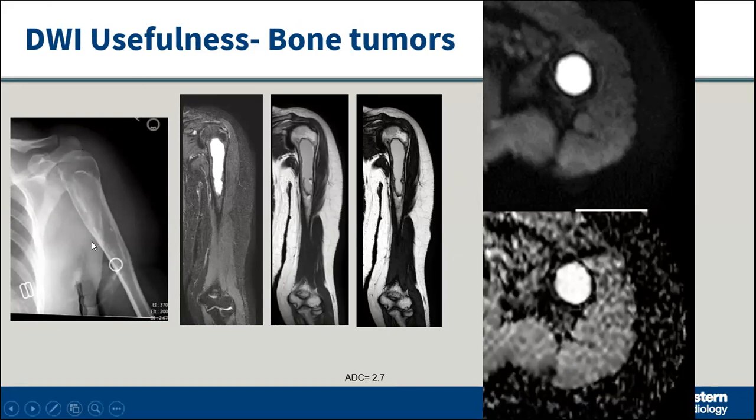So I'm starting with a very simple lesion, a well-defined zone of sclerosis, an elongated lesion along the bone. As the bone grows, it grows back into the diaphysis; it starts in the metaphysis. So you can see this cystic area there on T2 Dixon: water image, in phase, opposed phase. This opposed phase, or out of phase, is very good to find the margins of the lesion, or if there are any fractures, or any internal stuff, hemorrhage, etc.